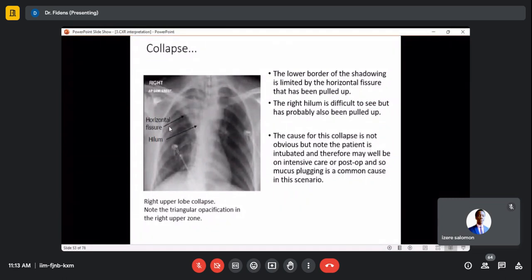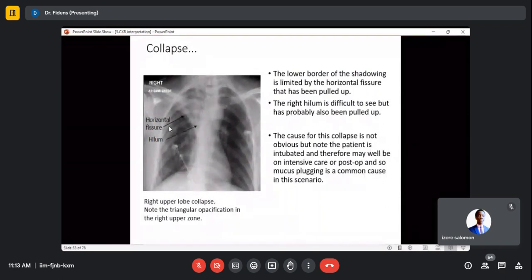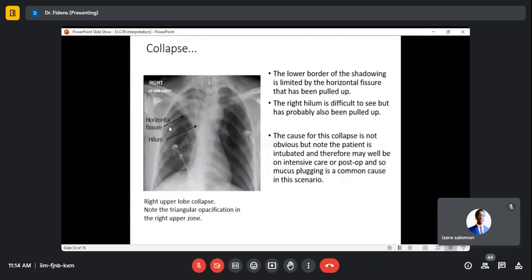Actually, I didn't get the concept of the ET tube and the carina and the tip. I said in radiology, after inserting the endotracheal tube, sometimes the only indication to do a chest radiograph is to see if it is well inserted or not.